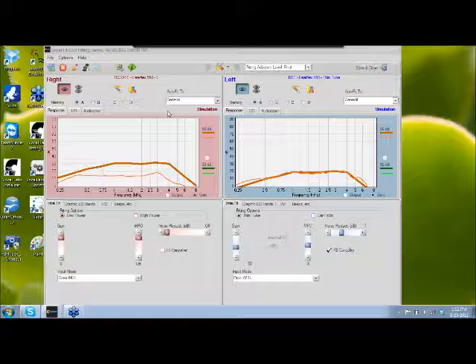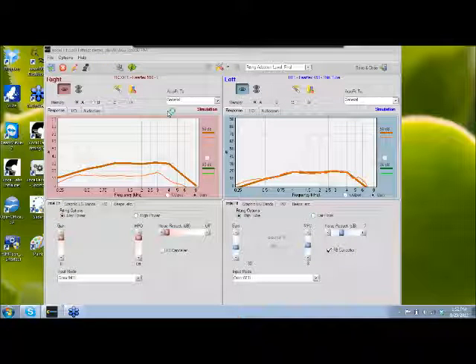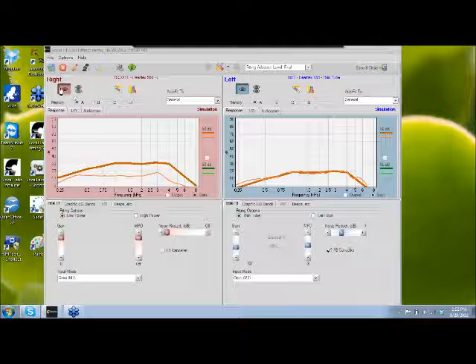This webinar we are going to be talking about a specific feature in the Vocal Labs software. The reason it's not in the other webinars is because this is a feature that's fairly unique to Vocal Labs fitting software. It's something that I like to call the Googley eyes. It's these little eyeballs that you see up here in the corner of your fitting screen.